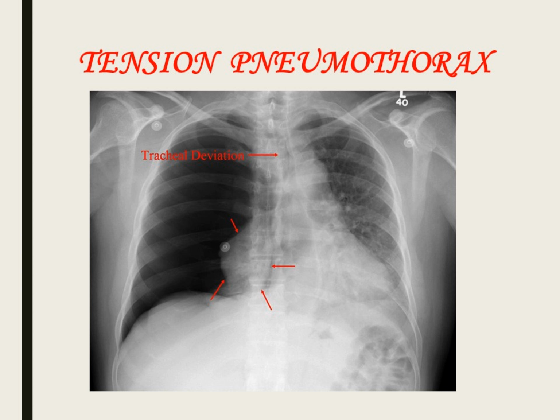Look at the lungs. Do they look the same to you, right and left? No. Why don't they look the same? The lung is collapsed here. That's your right lung. So this is all pretty much pneumothorax with full collapse of this side. When you look at the lungs, look at vascularity. There should be lines in the lungs, right? We have vessels, we have airways. What do you see here? Nothing. There's no lung. There's not a single little line.